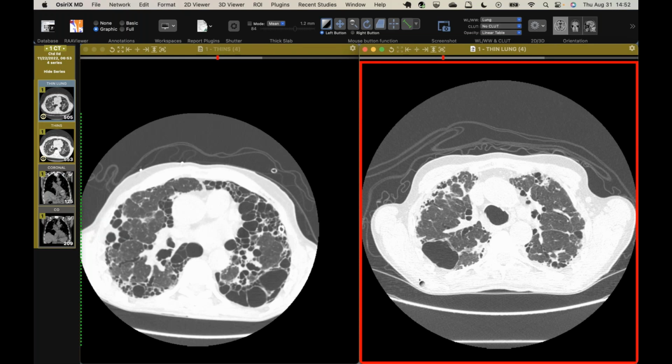We were discussing this phenomenon about 10 or 15 years ago, you and I and some others in the conference, and for a while we were talking about this being pseudo honeycombing, and we had a case then that our pathologist looked at, and he said, "This is not honeycombing. This is a kind of emphysema because of the thinness of the wall. There wasn't the fibrotic process. There weren't fibrotic capsules around the holes the way there is with real honeycombing." So he really said he was seeing emphysema. And these findings sure look like emphysema, particularly the merging of those big cysts into these larger collections.